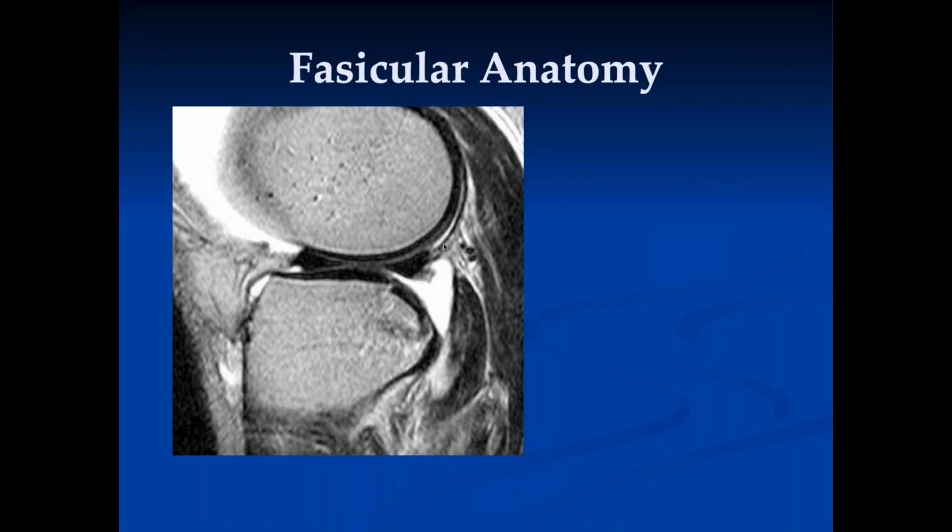And if you're medially, what you get is the superior fascicle, right through here.